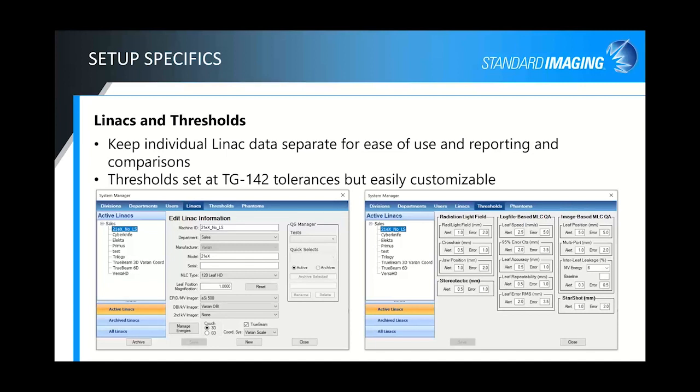Then we also have, on the right, our thresholds and tolerances screen. Everything is set to the defaults for the alerts and the errors for TG-142, but those are adjustable, so you can tighten or loosen those as you see fit. Very easily customizable for your specific facility's needs.